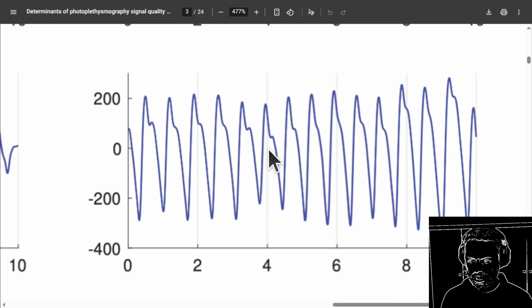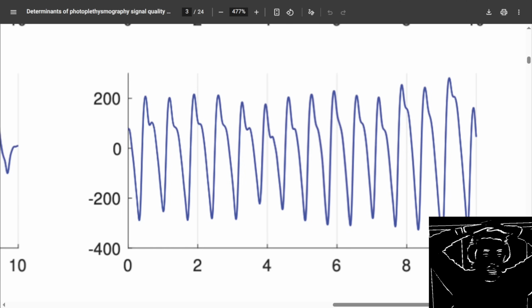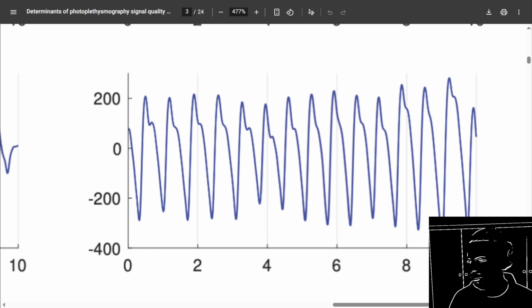Hey, can you look at the image again? Tell me if what you just said is correct. Yes, after reviewing the image again, my previous explanation is correct. The peak at second 6 clearly shows a more defined and pronounced dicrotic notch compared to the peak at second 4, which appears to have a less distinct feature. This reinforces the observation that the signal quality at second 6 is higher, allowing for better identification of these important waveform features. It seemed to be the other way around.